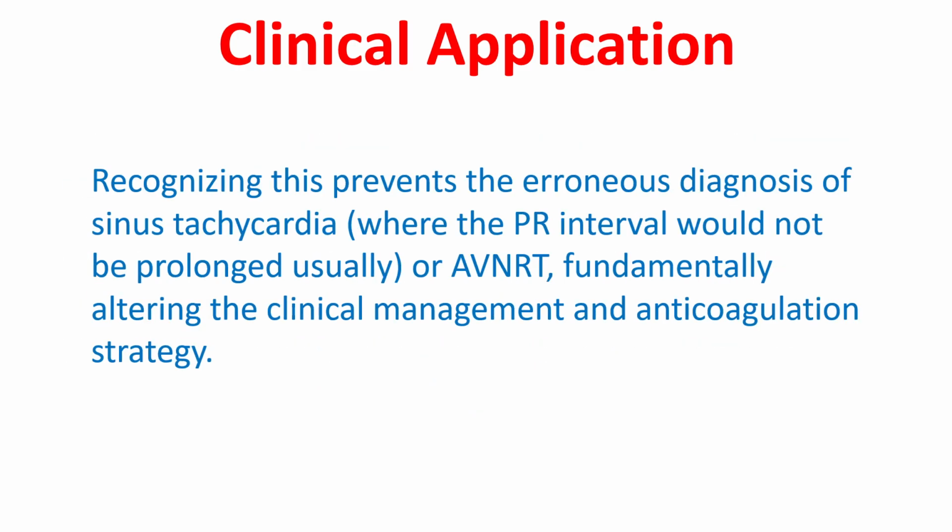Recognizing this prevents the erroneous diagnosis of sinus tachycardia, where the PR interval would not be prolonged usually, or AVNRT, fundamentally altering the clinical management and anticoagulation strategy.